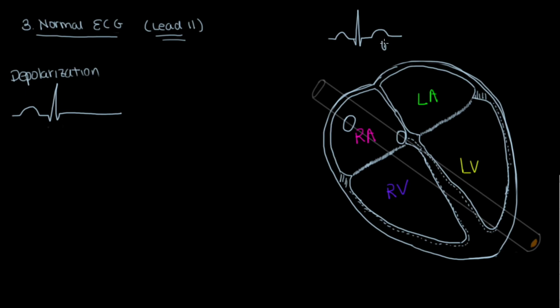And we're kind of missing this bump right there. And where that comes in is when we look at the repolarization.